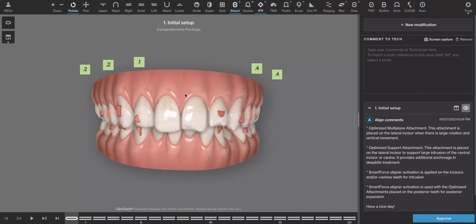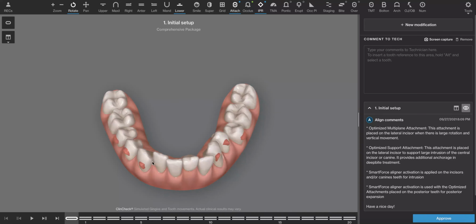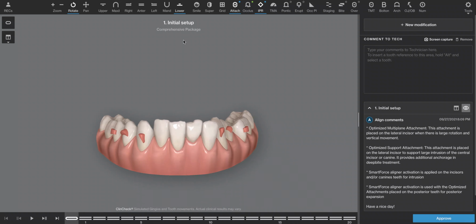When you do IPR, in this case it's lower mandibular excess, you would need to do IPR, interproximal reduction of the lower teeth, primarily the lower anterior teeth, in order to straighten these so that they don't interfere with the upper teeth, because again, you're already coupled. So either you spread the upper teeth out to create space so that you can get these in place, or you reduce tooth structure down here in order to get them aligned. This would be a retractive method.